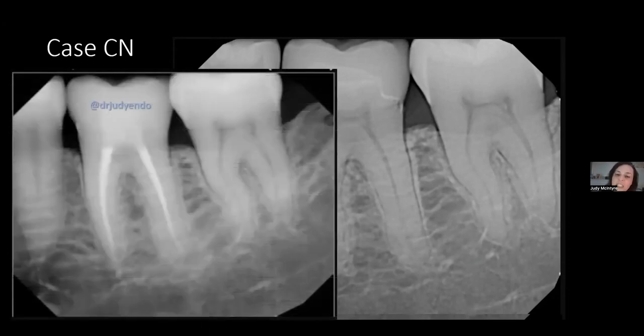Sure enough, I did the root canal, the core, and that horizontal bone. Again, we'll watch, but it's looking better. And dense horizontal bone. And what we start to notice is there's a small divot on this distal second molar when I took this final, and that is not there on this PA. Do you all see that?